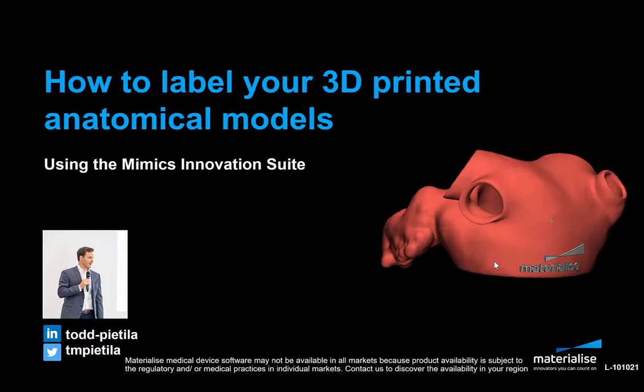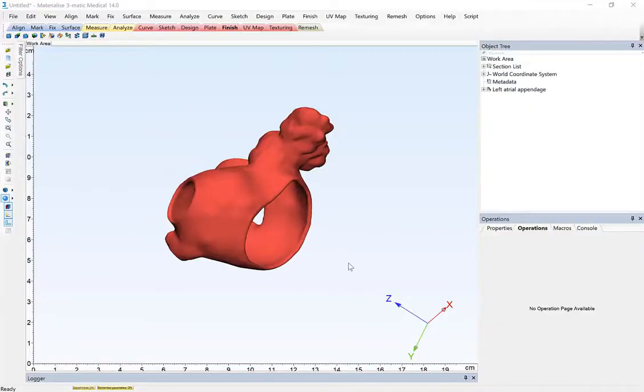This tutorial video will cover how to label your 3D printed anatomical models. Labeling is an important feature of the Mimics Innovation Suite, particularly for models that are used in a patient care setting. Being able to apply a label is important for quality and traceability of these models, whether it's applying a unique identifier to associate that model with a specific patient, or communicating virtual planning that may have taken place on that model, such as mirroring of contralateral anatomy. So let's take a look at how we apply a label with the Mimics Innovation Suite.